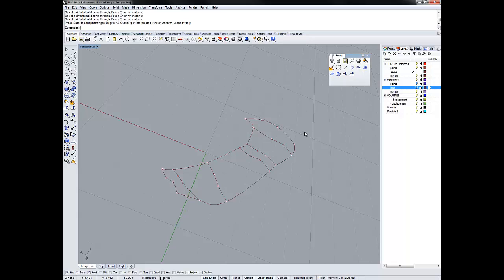There are a number of ways to do this. For this type of data, network of curves is the best route for you to take. I'll go over a couple others, but it's important to note that, in the same way that using a control point curve versus a curve through points can get lossy for your data, the curve network follows our trend of matching the exact surface of the diaphragm. So let's do this with network curves and see what the process is.